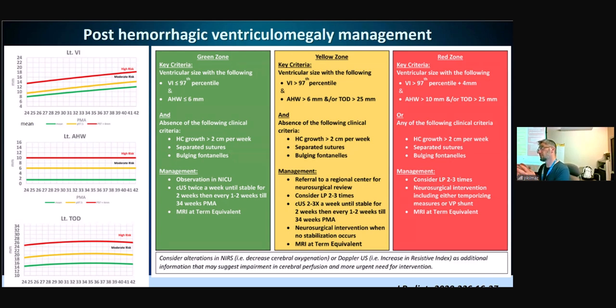In your reports, the grading is done based on the first ultrasound. For example, we do the ultrasound on the 4th day of life, and we say, okay, grade 3 germinal matrix hemorrhage. So the morbidity will be according to grade 3. So let's say you repeated the ultrasound the next week, and you saw some improvement. So the ventricular dilatation improved, so it became grade 2.